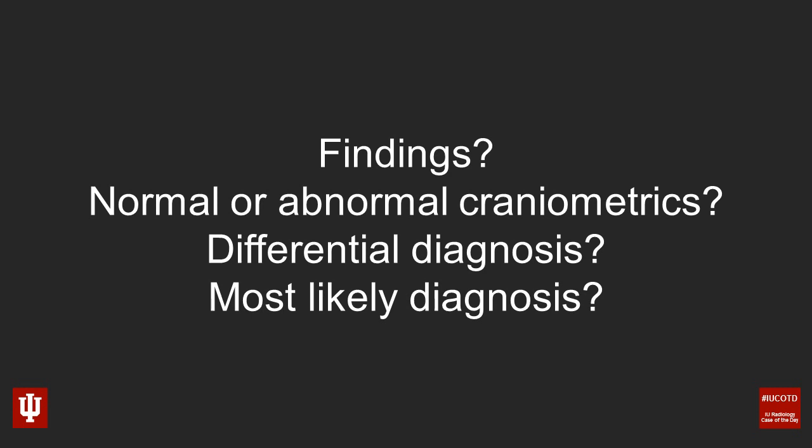Okay, I've got a bunch of questions for you this time. First of all, what are the findings? Second, does this patient have normal or abnormal craniometrics? Third, what's your differential diagnosis? And lastly, based upon what you're seeing here, what's your most likely diagnosis?